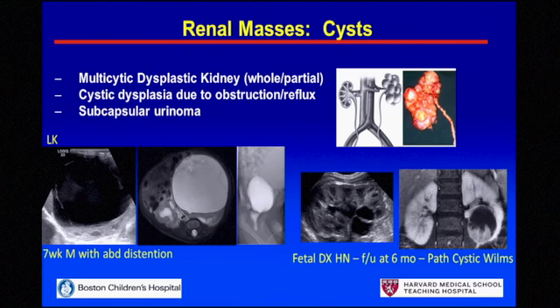So it was erroneously thought that this represented a primarily cystic renal tumor, and as it turns out, this little baby had posterior urethral valves, resulting in an obstruction, upstream fornix rupture, and creation of a perinephric urinoma, which mimicked a mass. So remember, not every cystic mass proves to be a neoplasm.